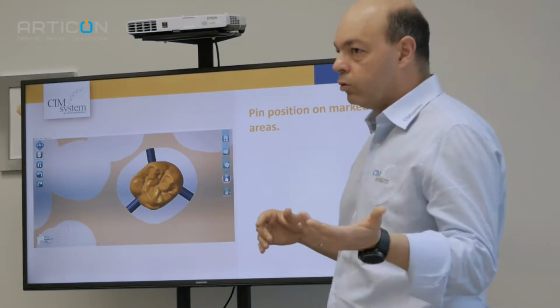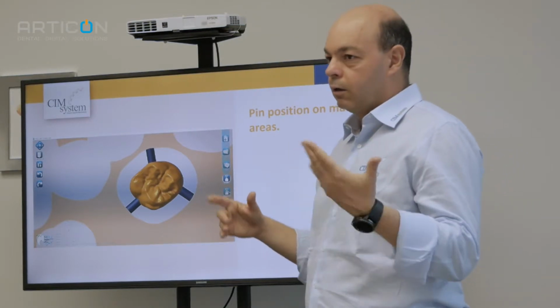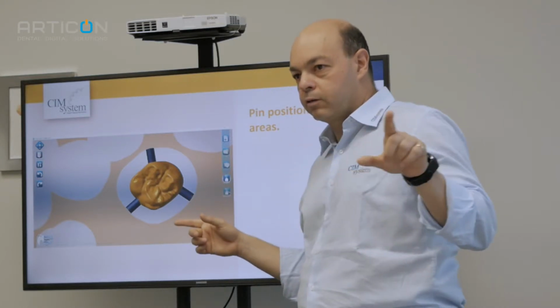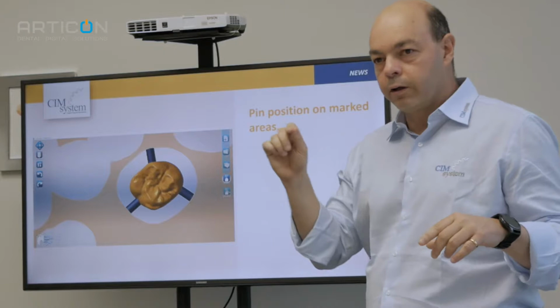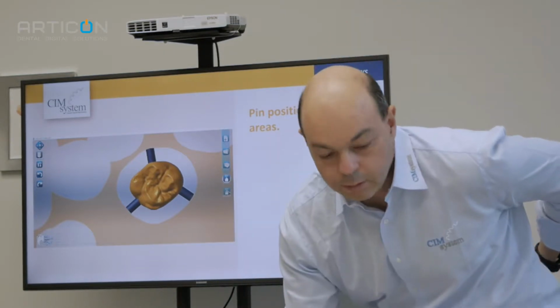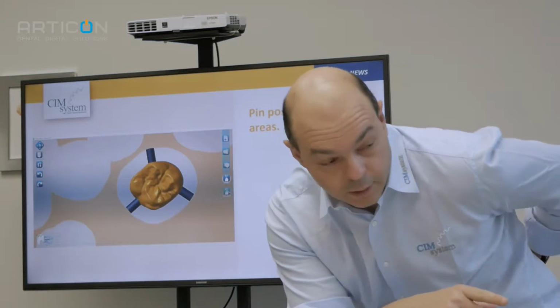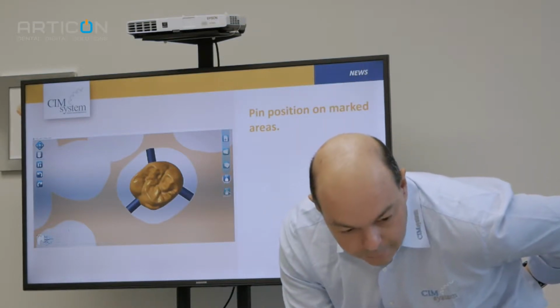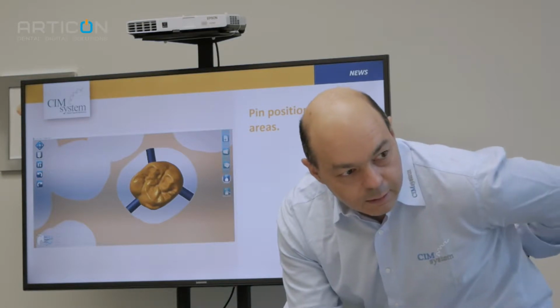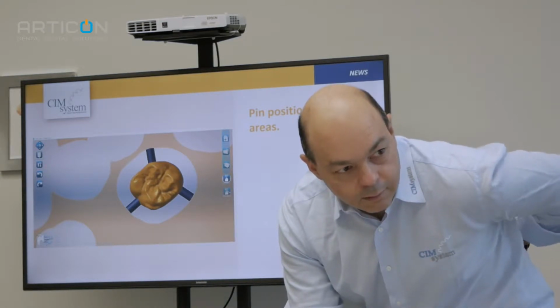But if you use exocad or another CAD and need this option, you need to open Lab 3D Explorer. You put the points, and automatically when I import, it recognizes them. 3Shape automatically recognizes if you set this. It's like last year's version of 3Shape, just an extra checkbox for the manufacturing side.